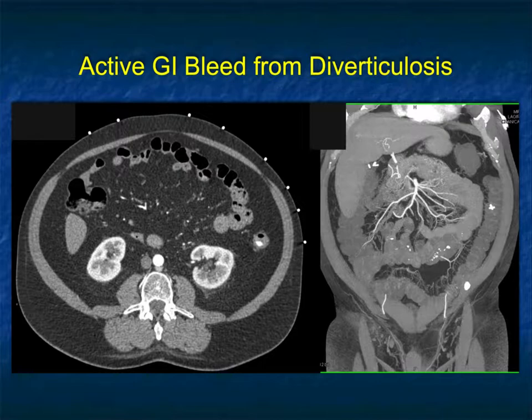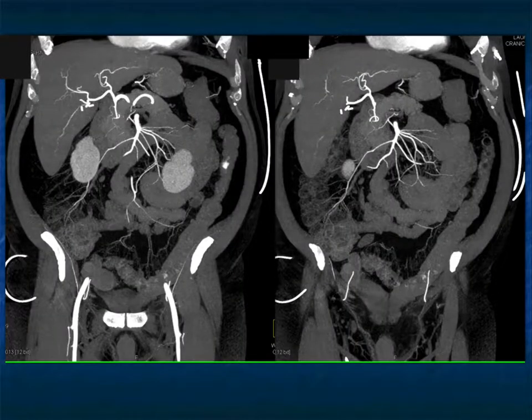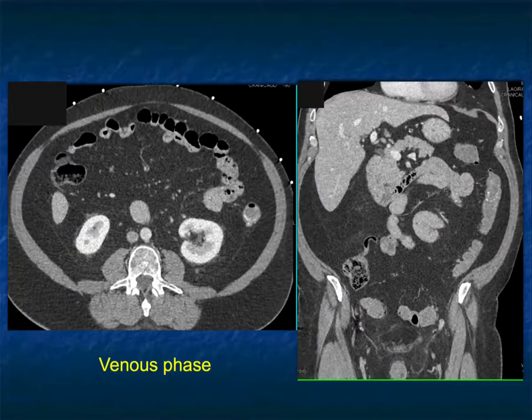Another example, look at the patient's left colon, look at the patient's SMA map. You see at least two areas of high density in the patient's left colon on the MIP imaging. But there's that very bright dot. So now you could say to yourself, is this blood? Yes, it is. Or is it just some foreign matter in the bowel? Well, as you go from those images, you also notice that there's some bleeding going on in the distal sigmoid colon down to the area as you get close to rectum.